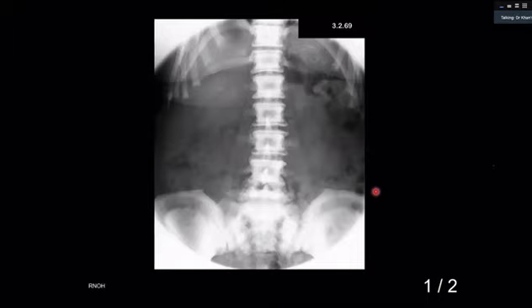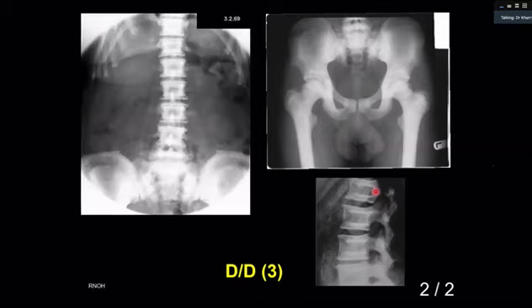So the point is, is there some specific sign here where you can say that this is osteopetrosis? This picture frame of the vertebra. Okay. Anything else? I can see some soft tissue calcifications over the left upper quadrant. Okay. No, I'm not interested there. Anything else? Right. So let me take over.